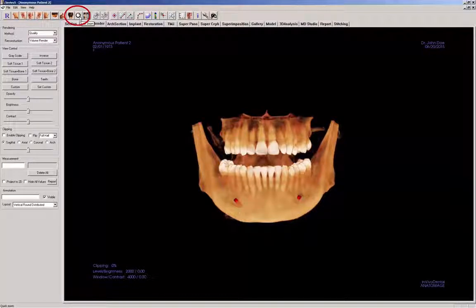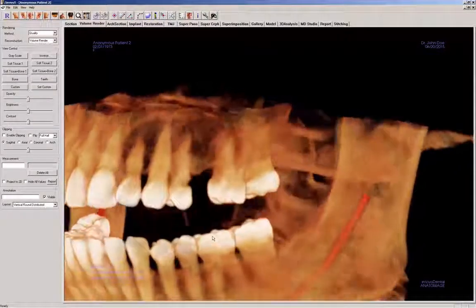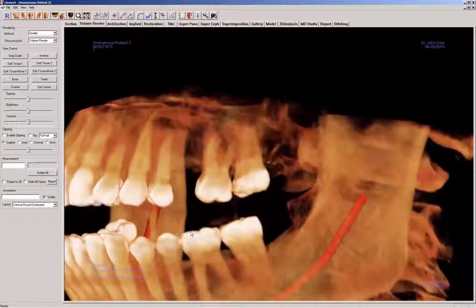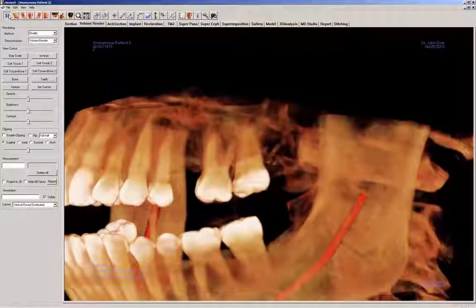There is a quick zoom tool on the toolbar that will enlarge the volume but keep an area of interest as the focal point. After clicking on its icon, move the mouse cursor to a desired location and mouse click to zoom. Use the Reset View icon to go back to the default size.